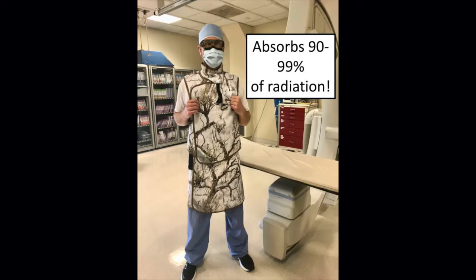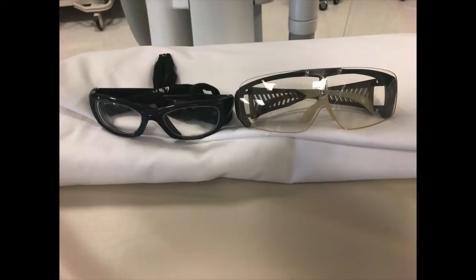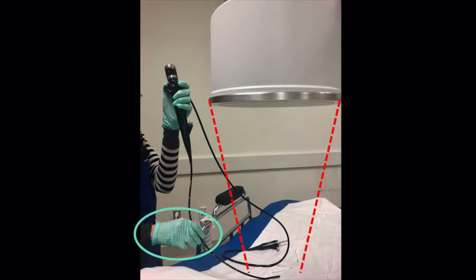Lead aprons or vests can absorb between 90 and 99% of radiation scatter, depending on the thickness of the lead. However, they leave the extremities and the head unprotected. Increased rates of cataracts have been documented in fluoroscopists, so lead glasses should be worn. Additionally, fluoroscopists should take care to avoid irradiation of their hands, which are at the highest risk for chronic exposure. Be sure to keep your hands out of the direct beam unless absolutely necessary for the procedure.